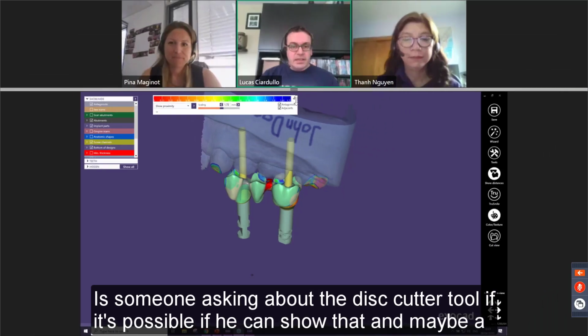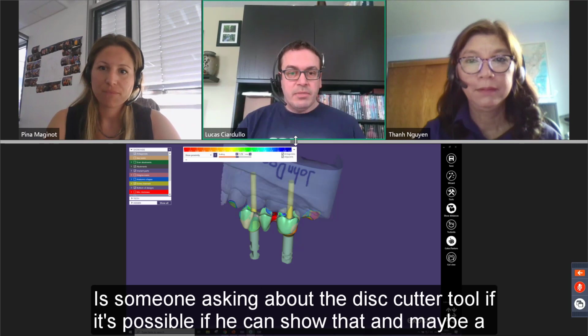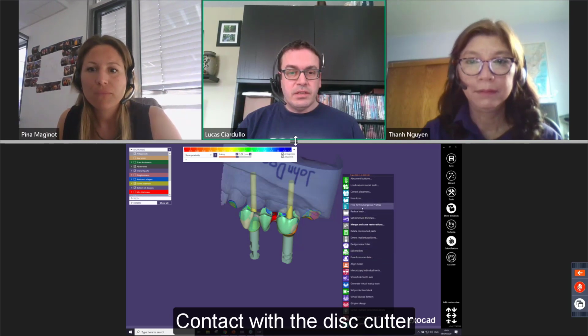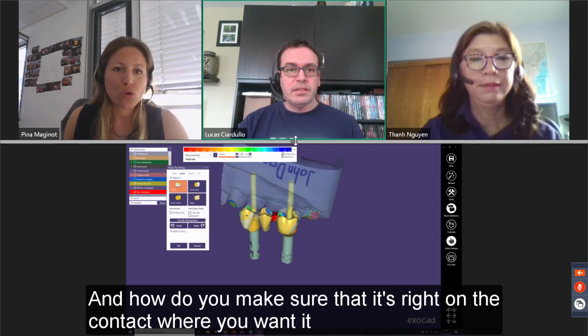Let's see what else we have here. Someone is asking about the disc cutter tool, if you can show that and maybe explain if it's possible to cut one contact with the disc cutter and how do you make sure that it's right on the contact where you want it?